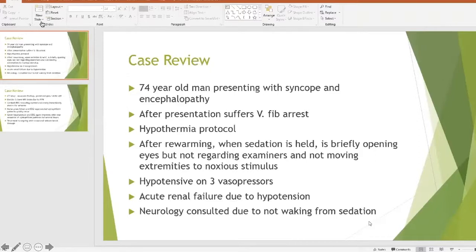And since the implementation of the Clarity software, it has really become a powerful piece of technology for us that not only allows us to treat our patients more effectively, but allows us to work in a smarter way, not necessarily a harder way, because it really gives us very accurate results very quickly that can be seen at the bedside by nursing, and they can apply treatment. And this case is an example of that.